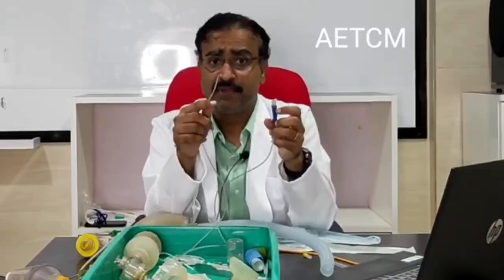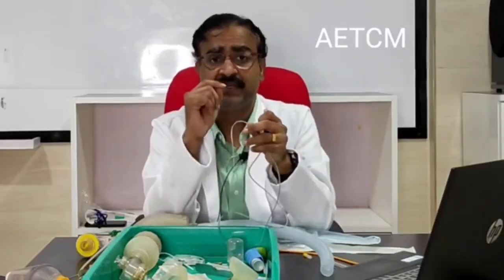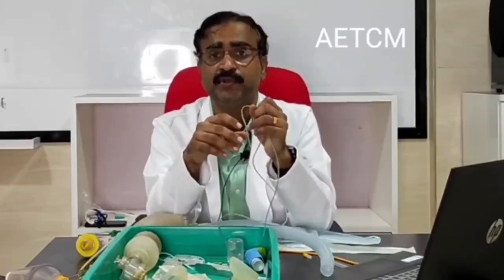So like I said, there are therapeutic uses and diagnostic uses. Among the diagnostic uses, you would like to send the early morning gastric lavage of a child in whom you are suspecting tuberculosis.